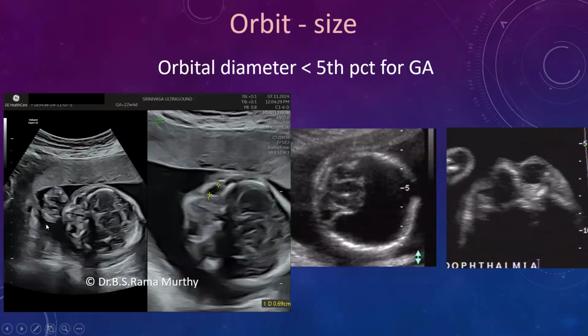So microphthalmia, as soon as you see it subjectively, you know that the two globes are very small, much smaller than they should be for this gestational age, and the intracranium could be normal, but you can also expect it in cases of holoprosencephaly. Again, rubella infection, any other serious infection can cause microphthalmia, and also some single gene disorders and syndromes.